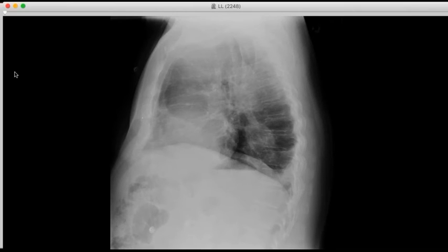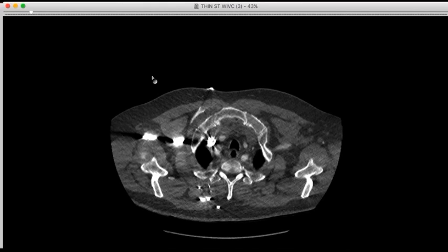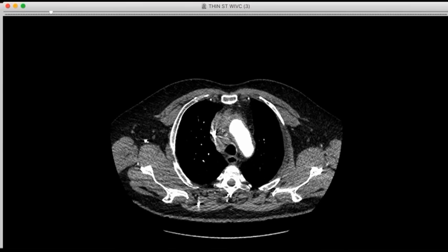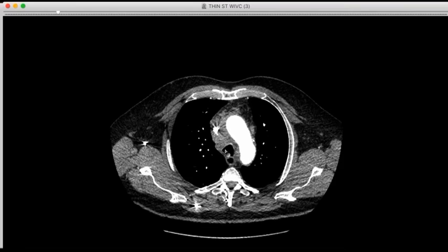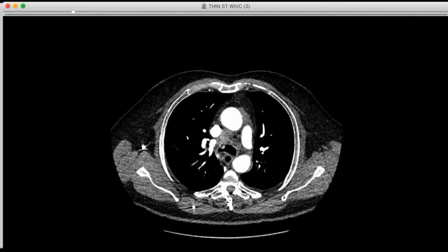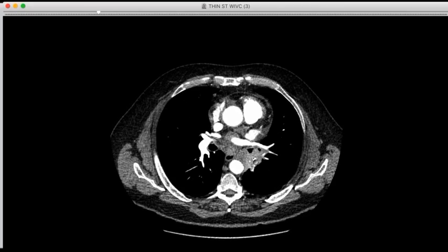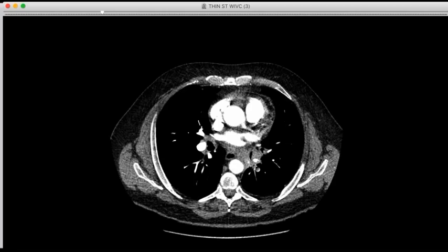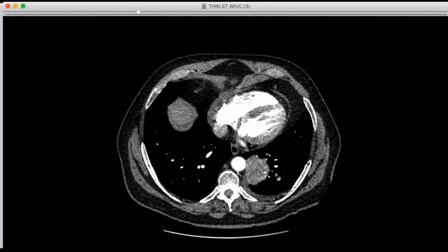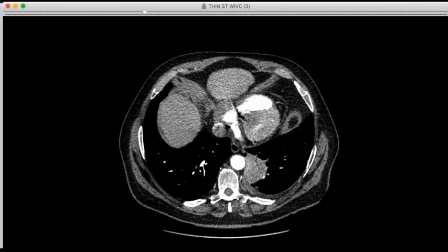But the patient was having this back pain, so they decided to do a chest, abdomen, pelvis aortic study. And you can see as we look here, there's tumor. Change the window. There's all this lymphadenopathy in the mediastinum, kind of confluent. The cava is narrowed, some down in the lower mediastinum as well. And then left hilar region, there's narrowing of the airway. There's a mass protruding here. And then inferiorly, we see the mass we saw on the radiograph.